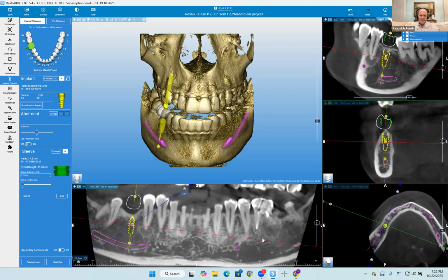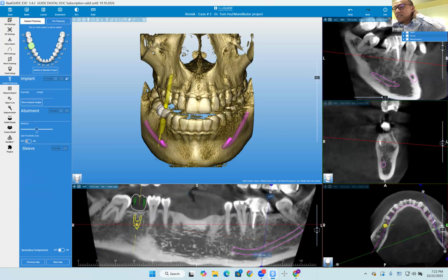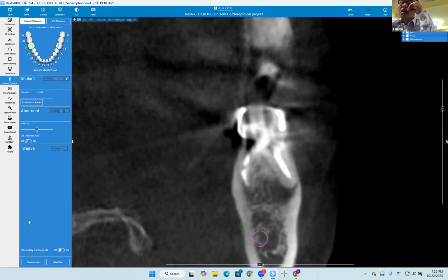Yeah, just one quick question. I didn't put that up there on number 19. That's a lesion on the distal there. Actually, the patient had a lesion 3 or 4 years ago. It's much bigger than that, about double the size of the distal canal right now. But right now, the patient has been asymptomatic, and there's still a little small error there.